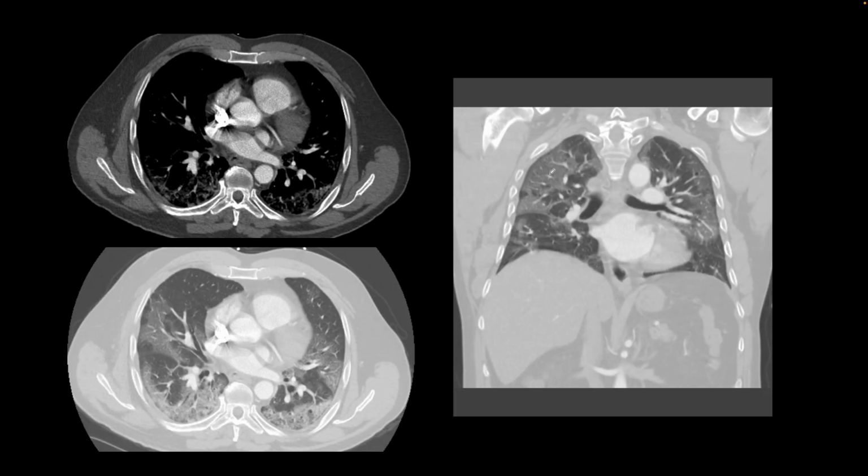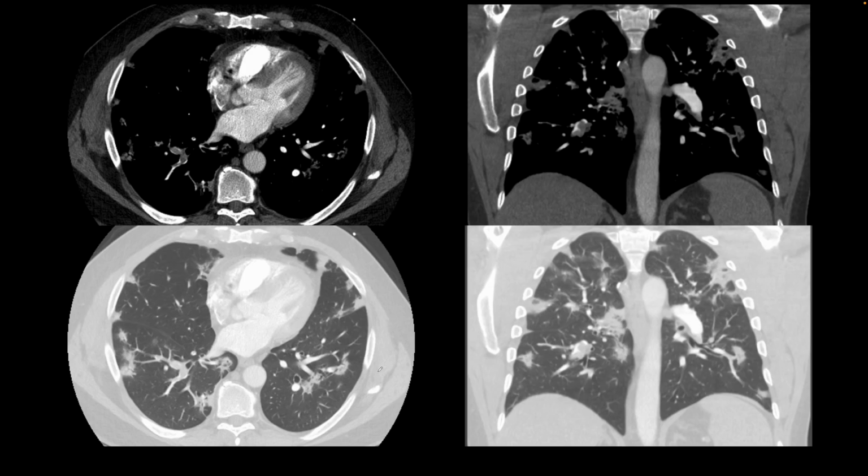Here is another patient where they were diagnosed with COVID-19 infection. We see characteristic findings on their CT-PE protocol, and we find these ground glass peripheral opacities in both lungs. This is another patient where they had COVID-19 but also had acute pulmonary embolism. So we see these filling defects in right lower pulmonary artery branches. We know now that COVID-19 predisposed to a coagulopathy, and these patients were at risk for developing thrombosis in the arteries and veins and at risk for acute pulmonary embolism.